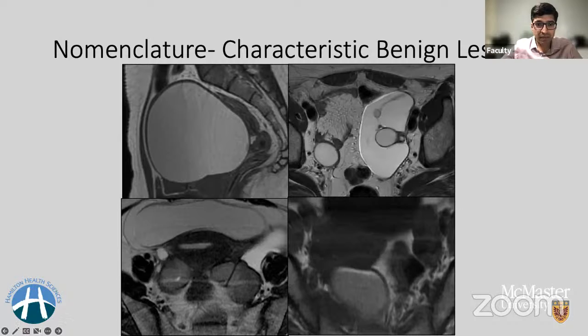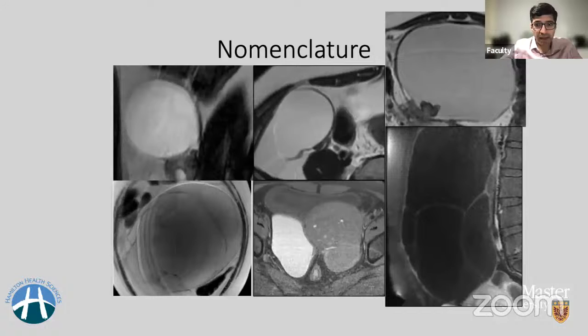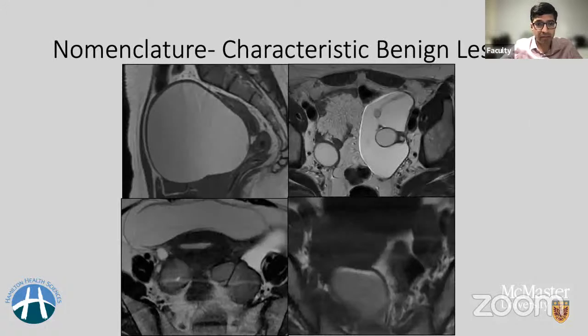This is a T1 weighted image. You see the dark uterus here, and this is a left adnexal mass, slightly posterior to the uterine fundus. It shows T1 hyperintense contents. It was nothing but lipid, so in keeping with a mature teratoma without solid tissue. An important teaching point here is that whenever you see cystic masses, also look for papillary projections. Some of those papillary projections will help you classify these lesions further.